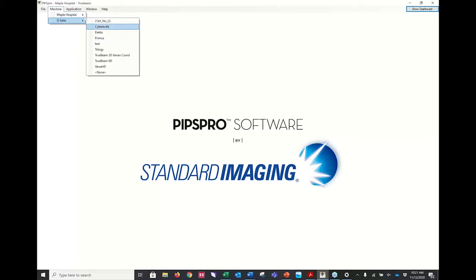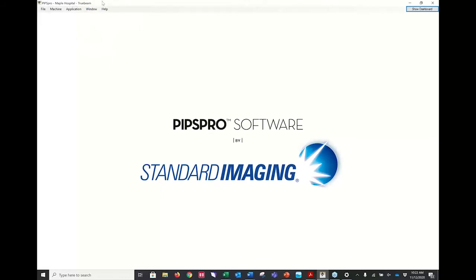Showing you just a list of the machines, for our SI sales group, we've got a number of setup machines on demo here, you can see. But for this particular test, our fictional Maple Hospital has just the TrueBeam. You'll see that is always the active linac, it'll always show you the active linac up in the top menu bar, of which one you're actually doing the test for.